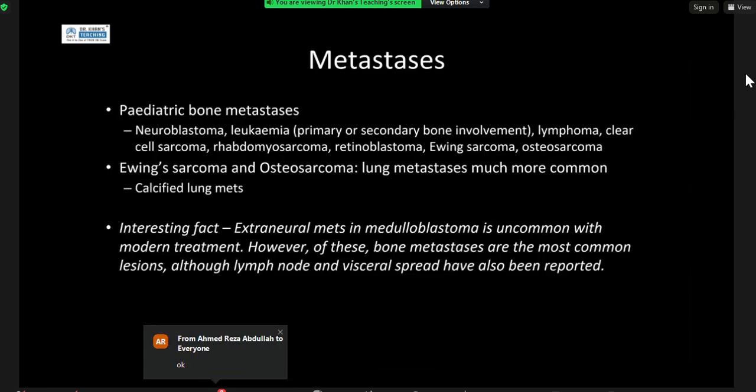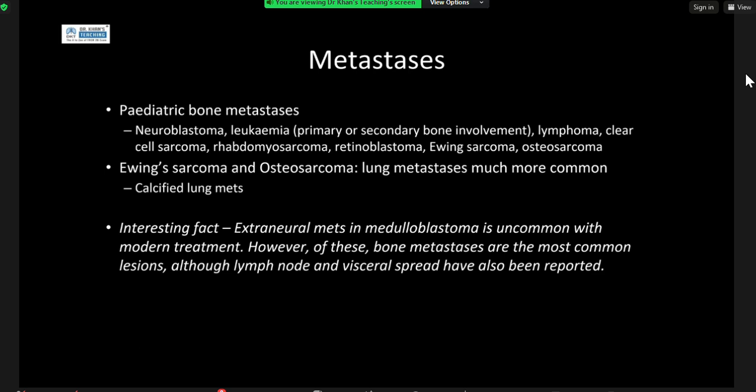Okay. So I think that this is a really nice case. Sam knows this case better than I do. I think the patient had a neuroblastoma, and the example is of a metastatic deposit in the distal femur. So thinking about metastases, I know in children it's not something that we jump to first, but having it in the differential is really important. And then, thinking about other types of sarcomas, you may be presented with, for example, lung metastases in a child, and thinking backwards. So you may not be given the original pathology, as in this case. You may be given a secondary or a metastatic deposit.